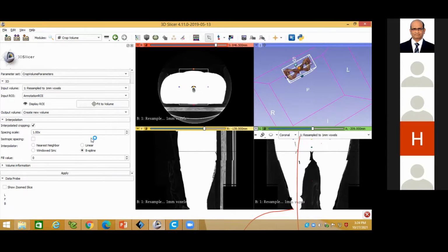It is taking some time because it has to calculate over the 400 images. In each image, it develops an individual outer boundary. Now, after computing, you can see how it looks. The total image is deleted except for whatever region is required. Only that region you can see.